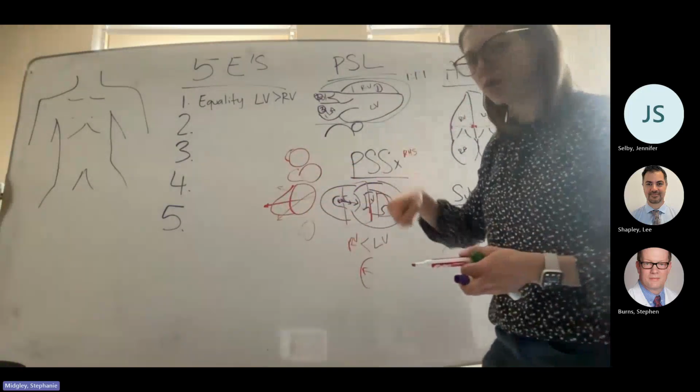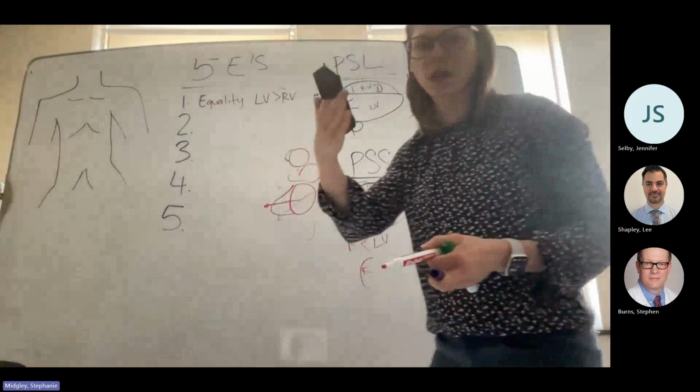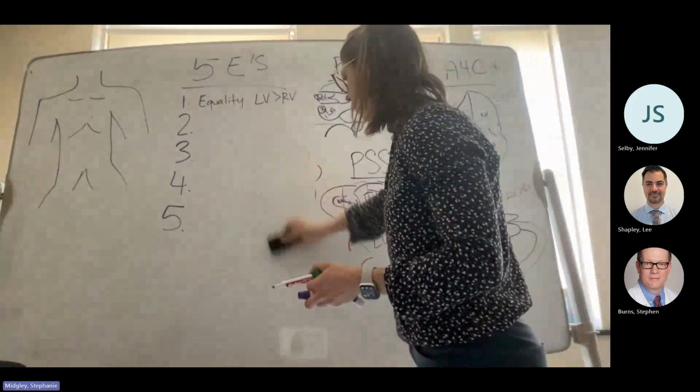So you just have to make sure that when you're doing your RV assessments, you're fanning through the whole heart to find where the RV is the biggest.